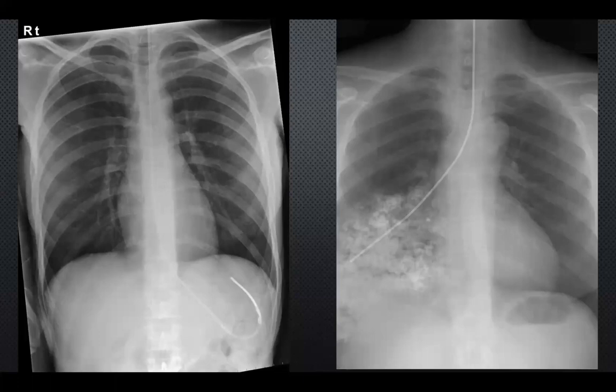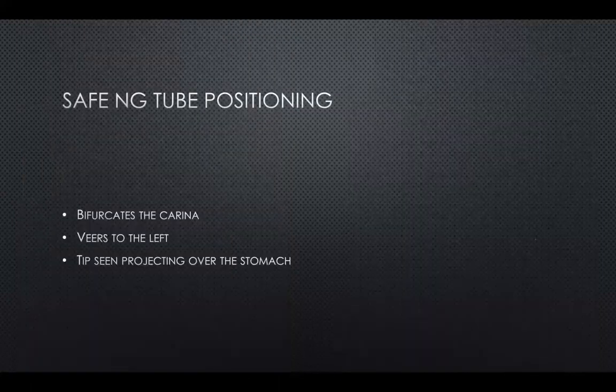So look: have they got any NG tubes, any central venous catheters, just any of the lines and tubes that lots of unwell patients will have in. They can also give you an idea of what's going on. So it's important to be able to pick up that this NG tube is in the wrong place and it's causing all of this consolidation. So this is just describing what I just said.